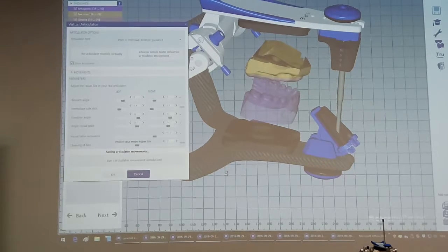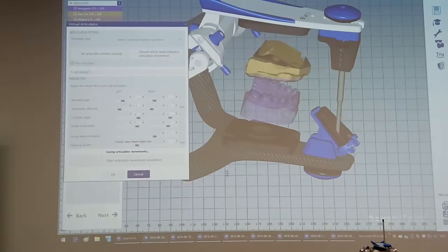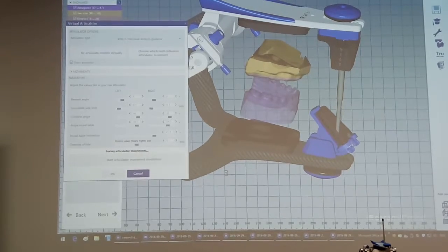What we are doing here is a construction which takes us around 2.5, 3 hours construction time. It's not done in a few minutes. It's a very complex construction. That's why I have prepared several steps where we can go a little bit faster through the construction.